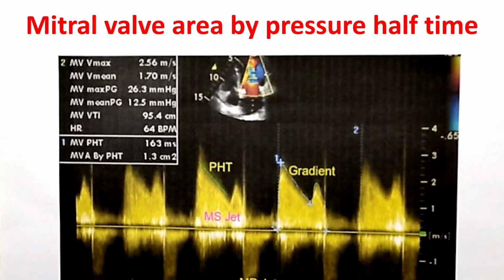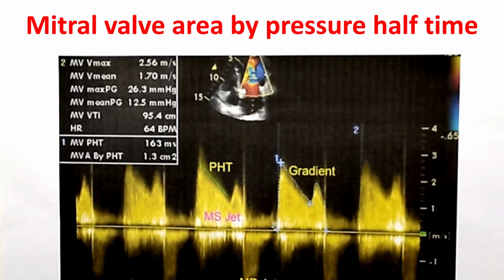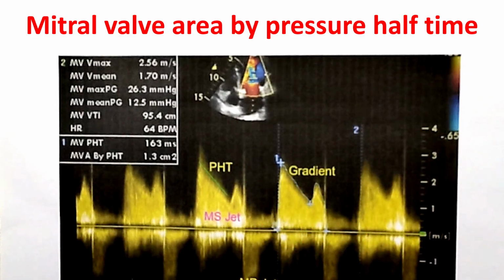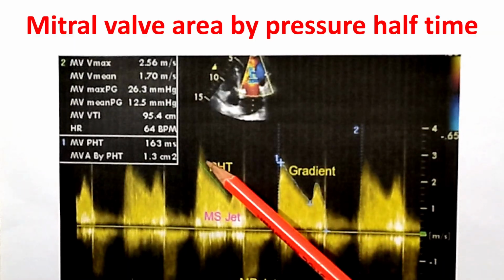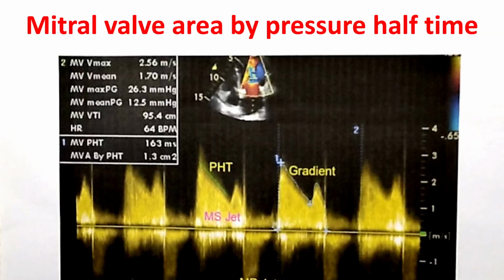If you divide 220 by the observed pressure half time, you get the mitral valve area. And we know that pressure is equal to 4V squared by Bernoulli or modified Bernoulli equation. So the corresponding velocity will be related to the square root of the peak pressure.